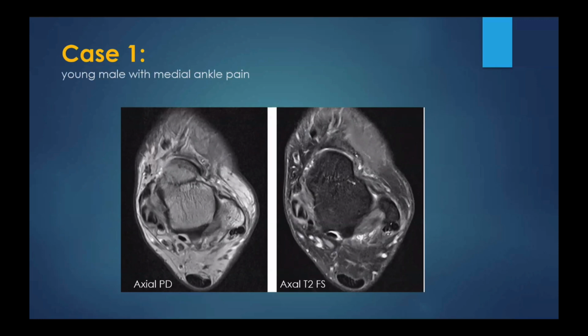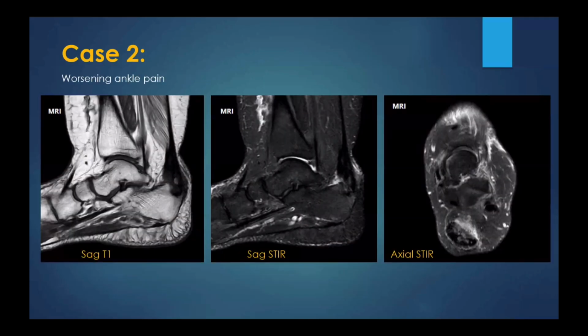First, I got two cases just to look at it and challenge yourself. First case is young male patient with medial ankle pain. And the second case is worsening ankle pain, and we got two sagittal and one axial cut. We will answer these questions at the end of the session.